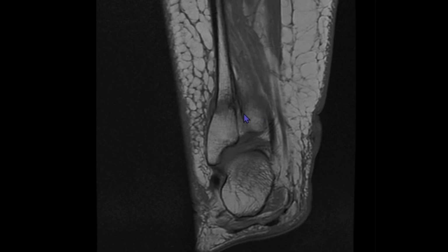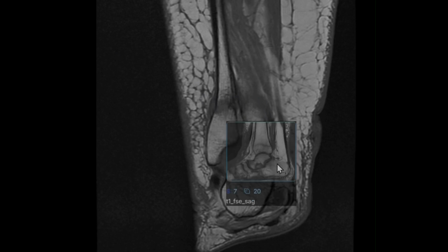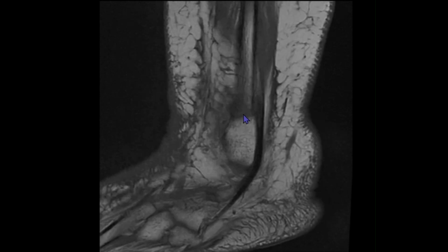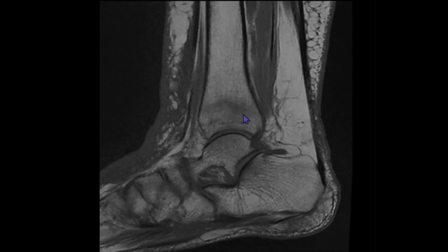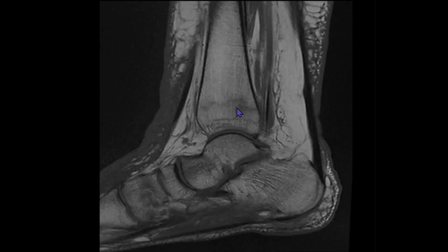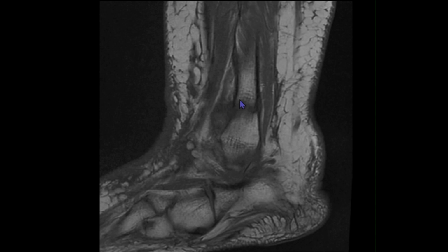So the fracture in the distal fibula is a bit subacute because we have got a callus formation here as well. On the other hand, in the tibia, the fracture is involving only one cortex. It is not through and through like the fracture that we see on the fibular aspect. So both of these are types of insufficiency fractures.